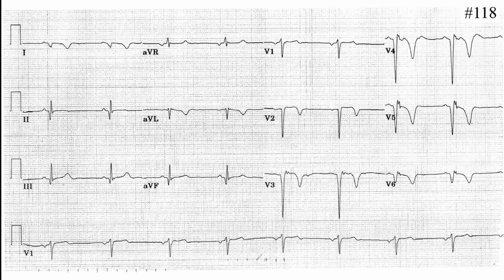Okay. Yeah. And it's at 1, 2, 3, 4, 5. Okay, 1, 2, 3, 4, 5. So it means around 60. 60, all right. 60 beats per minute. So it's normal. All right.